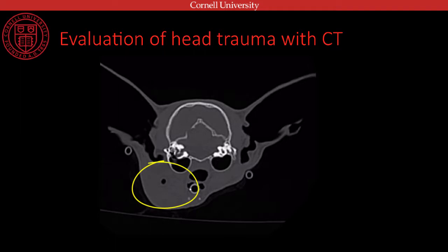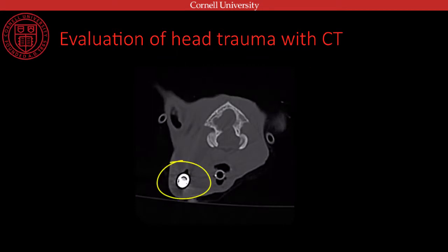So it's sitting in the soft tissues peripheral to the bulla, quite a hot area of maxillary artery and carotid bifurcation at this level. So a little bit close to big vasculature, but clearly she's done well. And you can see the soft tissue swelling that's happened as a result of this. And then this is the arrowhead sitting down in the neck, muscles of the neck here. This is her larynx. And that's her occipital bone. So we're sort of caudal head at that level.